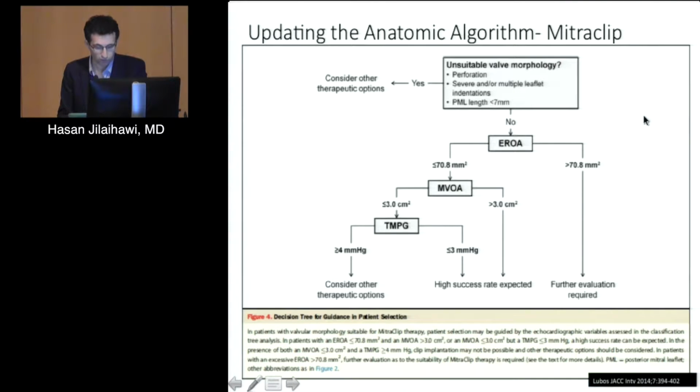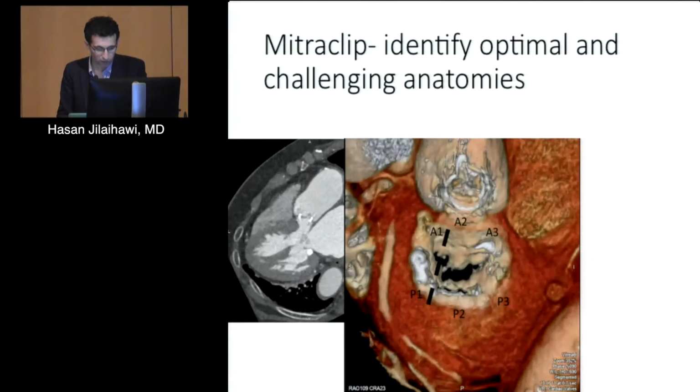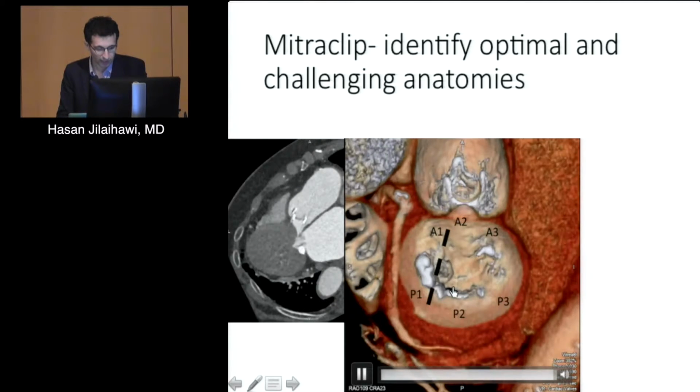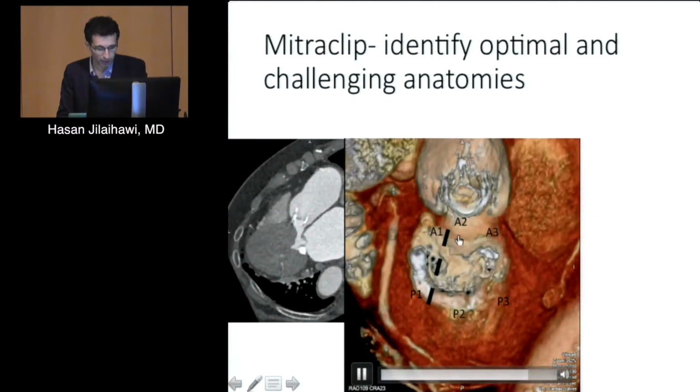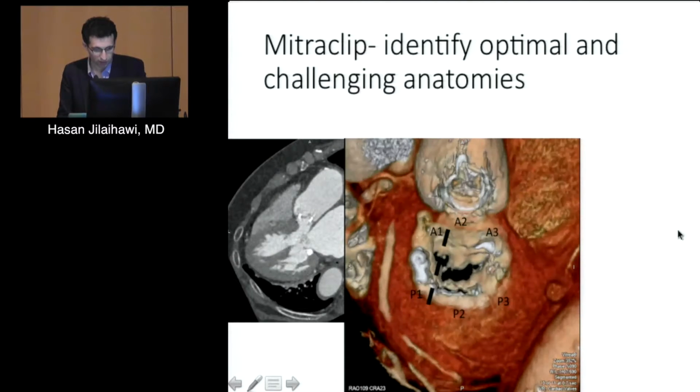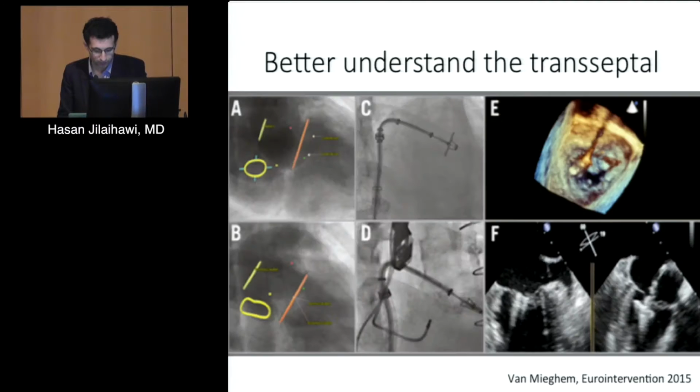We can screen for all of these on CT, and we can also use 4D motion to identify the actual area of problem, and couple this with a transthoracic echo to assess patients comprehensively pre-op.